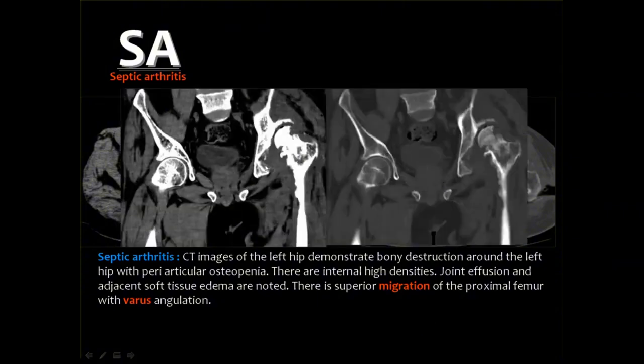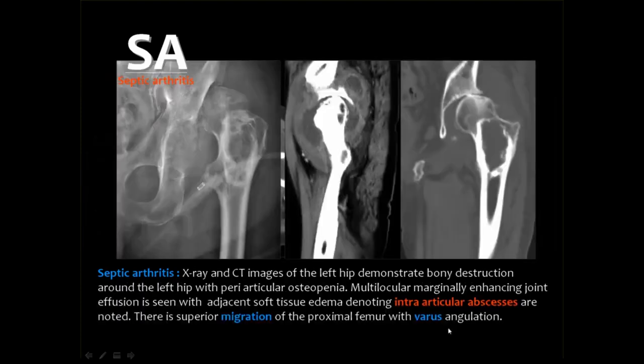And you see the femoral head has migrated upwards and is falsely articulating with the ilium.